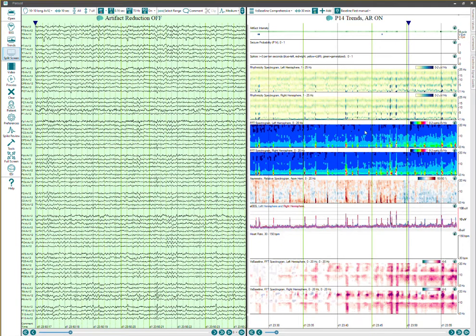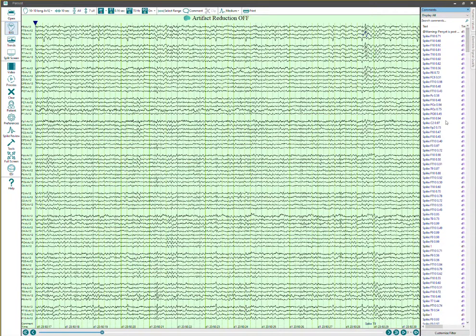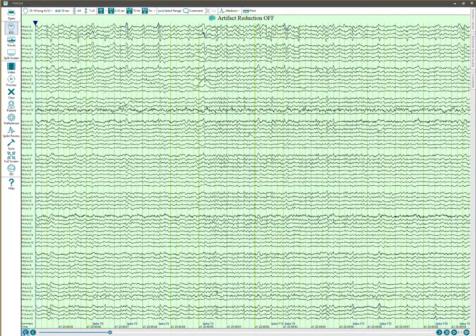Okay, well, we're going to look at spikes, so let's go ahead and do that. I'm going to go to the EEG, and we'll bring up the comment list. You can go through comments this way, but there's a lot of detections, and so let's use Spike Review. But before we do that, let's page back a bit, and we can see where there's a number of spike marks on this page, and we don't have the EKG channel displayed. Let's see what's happening here, because this is very periodic. It looks like that's EKG artifact.